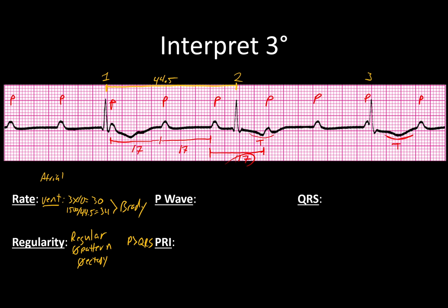That's good to know. While I'm busy measuring, we'll just go ahead and do our P wave analysis because I've been staring at them anyway. And we note that we are uniform, upright, regular, more P's than QRS, so I'm dealing with a block.